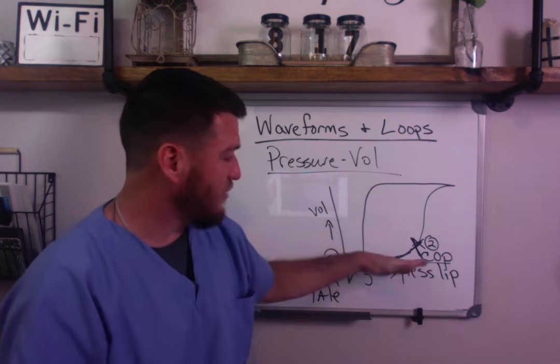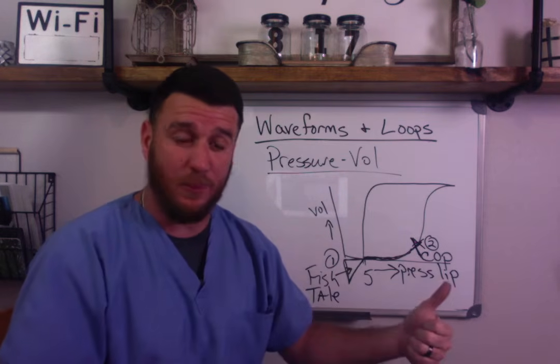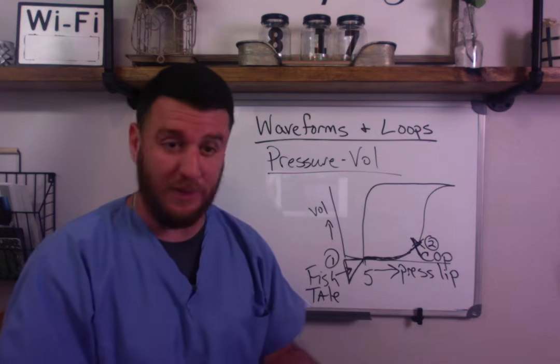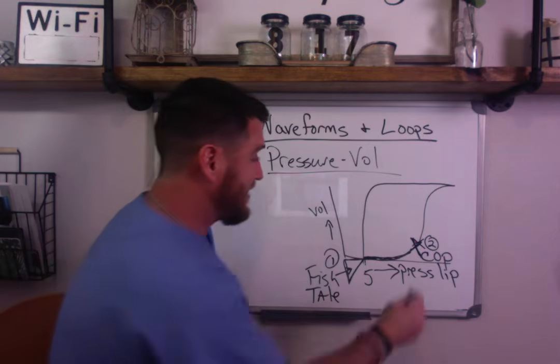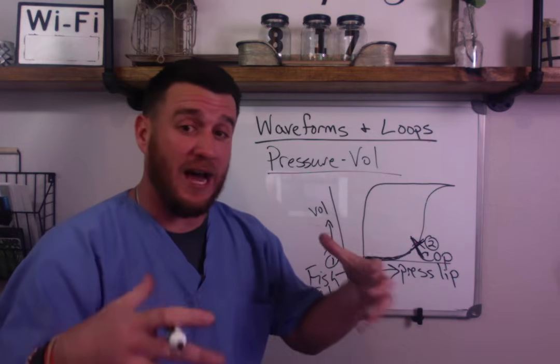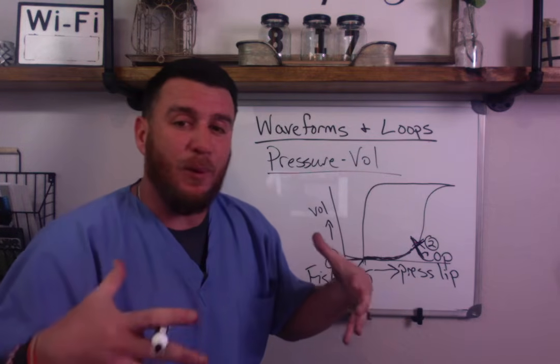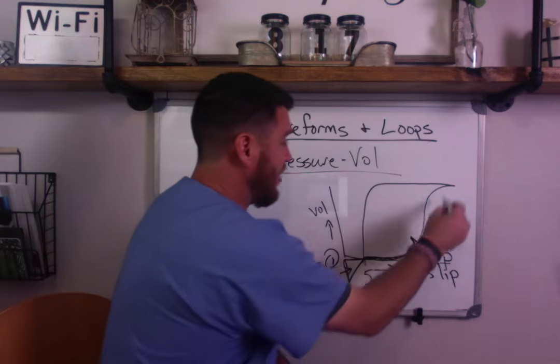I like to say don't give the cop lip. So you put those 2 things together. Critical opening point goes with lower inflection point. And what this will tell you is ideally in theory, if we could set our PEEP here, then that would be optimal PEEP because we could hold the alveoli open to that point to where they're ready to receive volume.